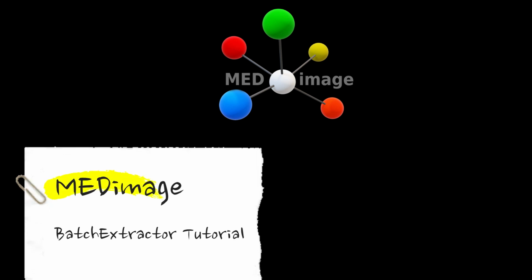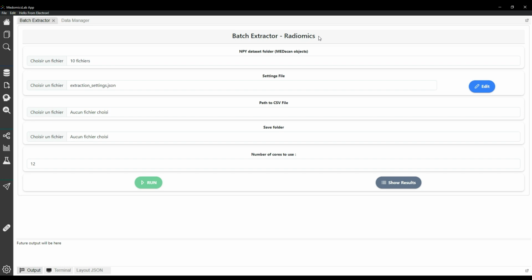I am representing the MEDiml lab team, and in this tutorial, we will explore the batch feature extraction page. Let's begin by configuring the inputs. As a reminder, tooltips are available by hovering over the text to provide additional information about each input.